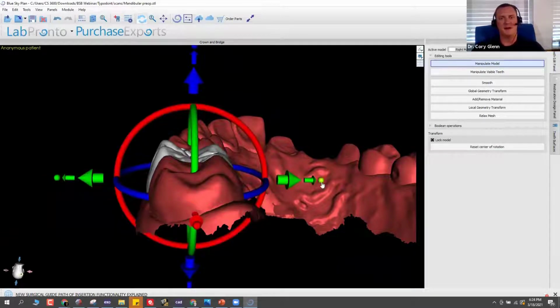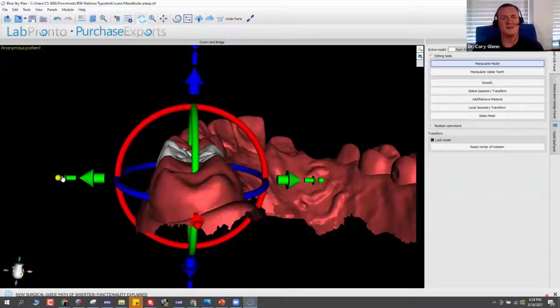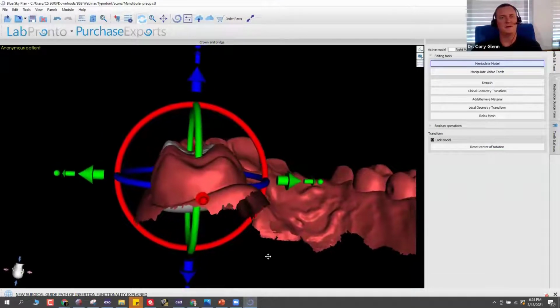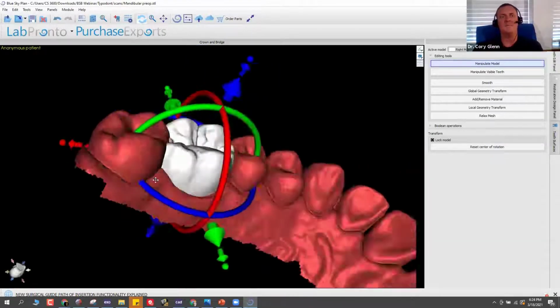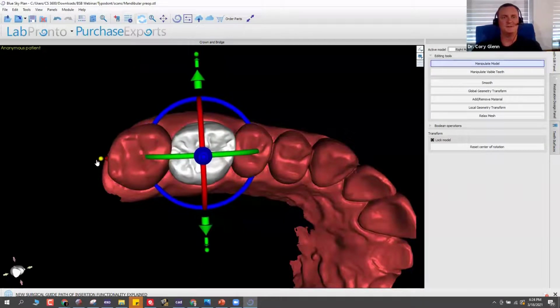And it looks like it might be a little wider than these teeth. So I can use that little point at the end to scale back the size. And so now the angulation looks good. The central groove depth is about the same and the cusps are in the same line. Now I can be looking at the mesial to distal spacing. So this needs to be shrunken down a little bit.